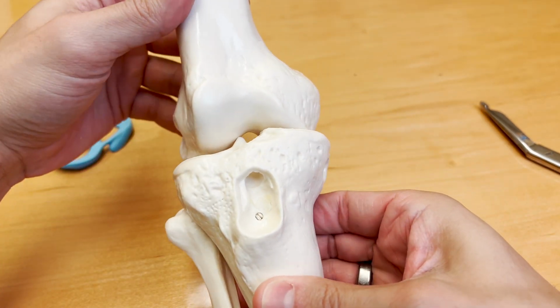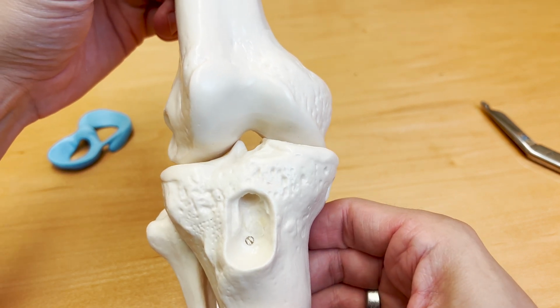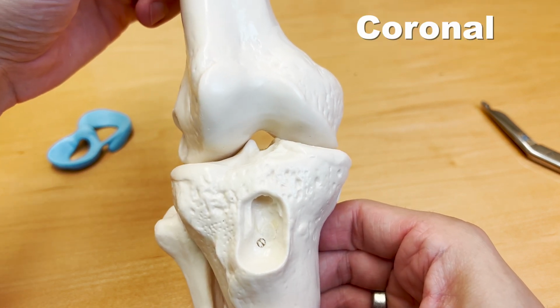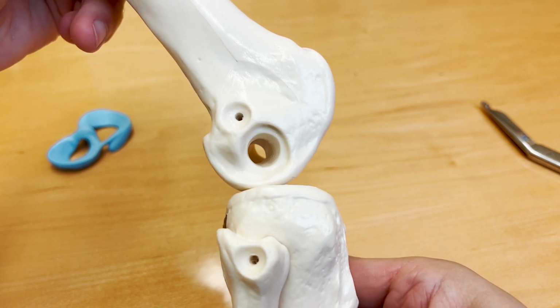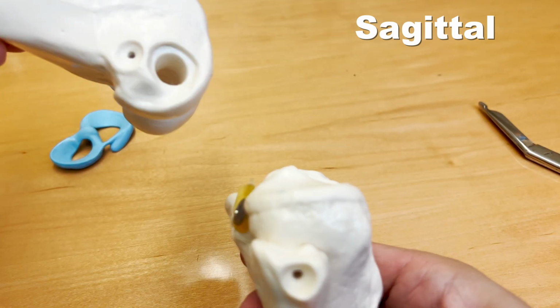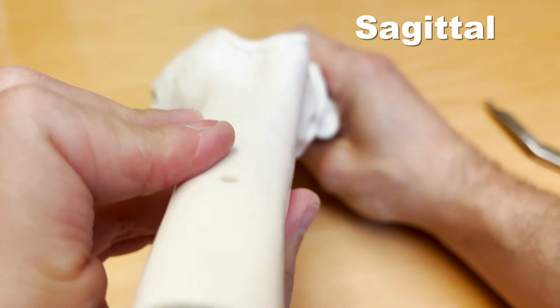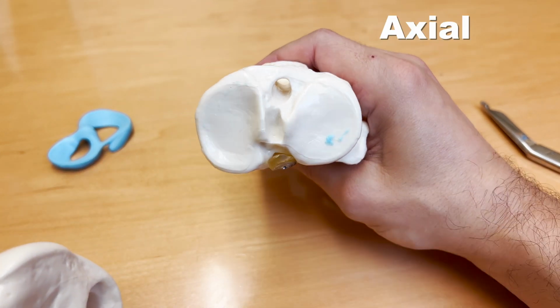So this is looking straight at the knee. And when we're looking straight at the knee on an MRI, we call that the coronal imaging. If we look at the knee from the side, we call that the sagittal imaging. And then if we look at the knee from top down and we make cuts through that and we move through the knee joint, we call that the axial imaging.